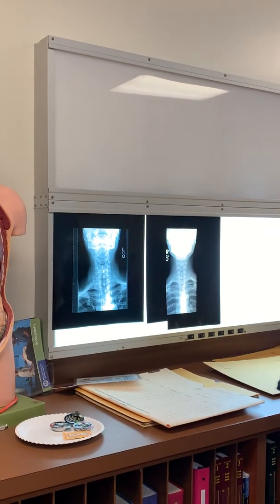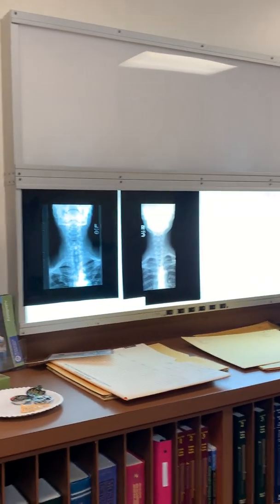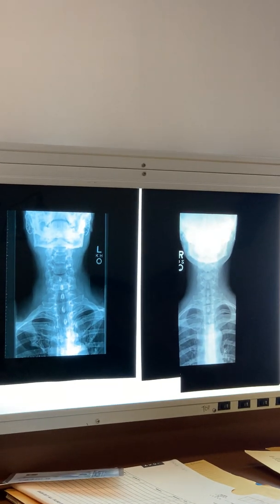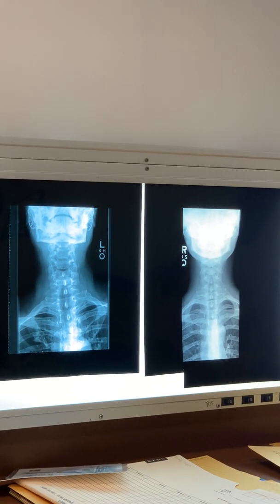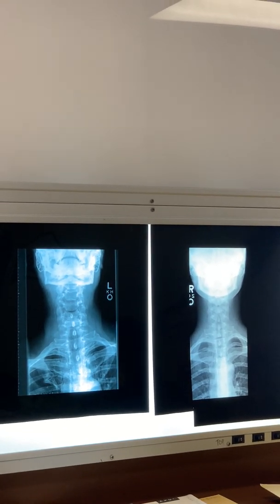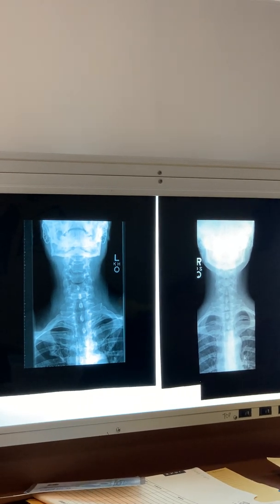Vertebrates, should I see? All 7. Nope. It says on it, C3 to 7. Okay, C1 and C2, a lot of times you don't see because of either the mandible or the occipital bone. Usually the mandible.